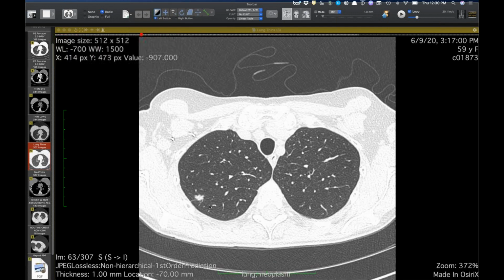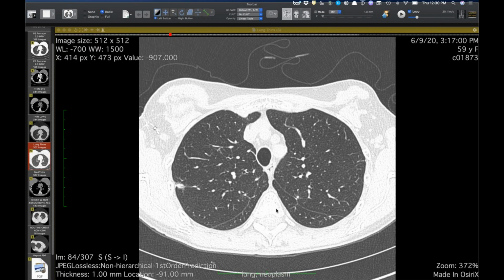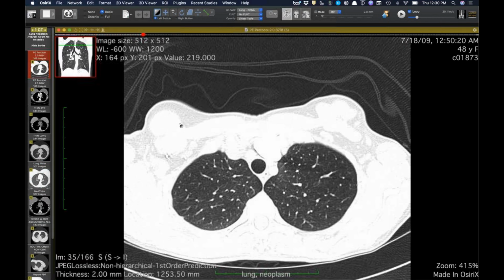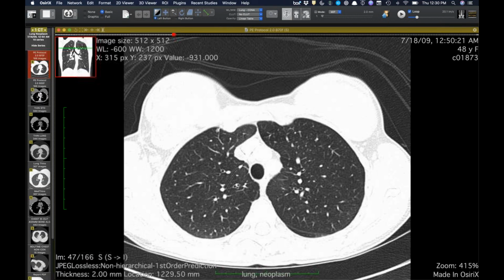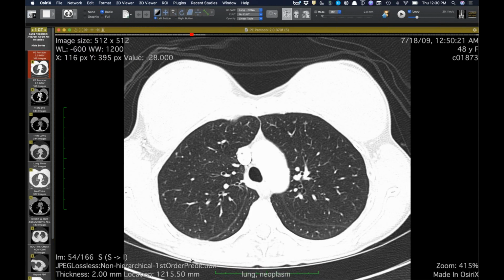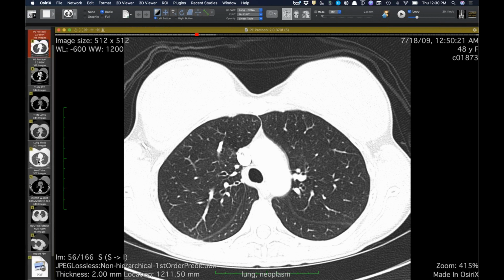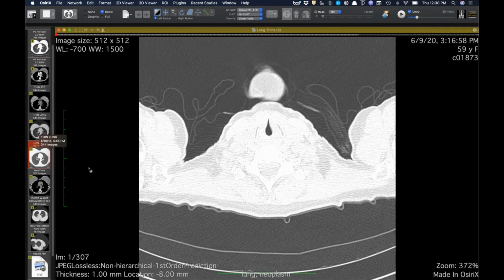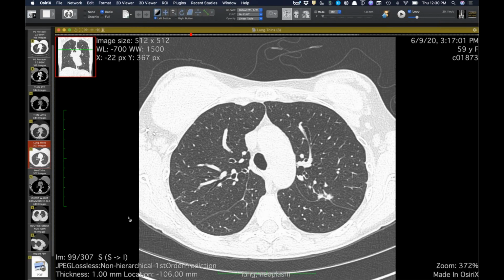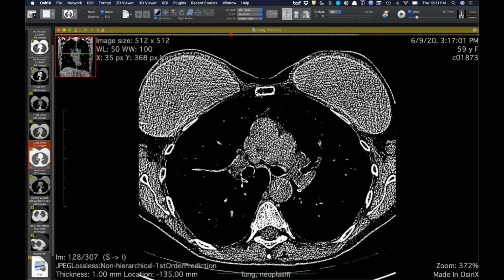And then the last case is an interesting case because it has a nice sinus venosus. You can see pulmonary veins coming in, even the inferior pulmonary vein is kind of directed towards the right atrium. The superior pulmonary vein comes in here. So it's a sinus venosus ASD with PAPVR, undiagnosed. This is an immigrant coming in and has obviously a blown out RV.